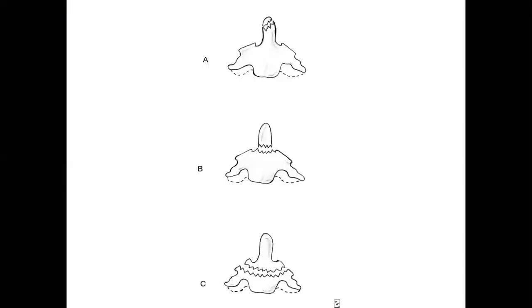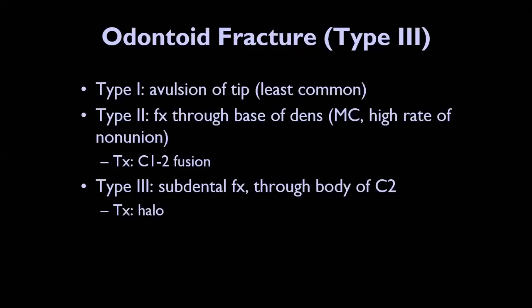Yes. So this is the tip, which is type 1 and type 2 and type 3, which have better prognosis. So this is a type 3, which is subdental and includes the body, okay?